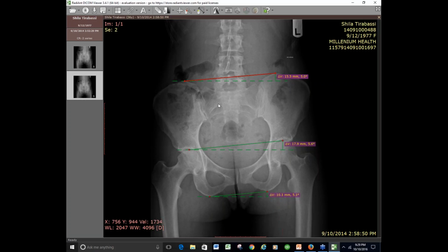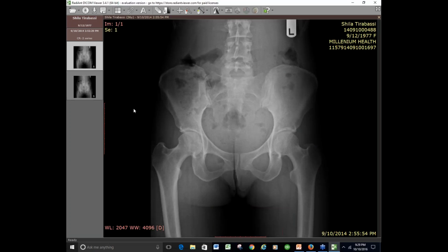So let's actually look at that with her other image here. Give me just one second. There we go. So this is her with a lift in. Let me make you all reappear. Okay. So now, here she is wearing a lift.